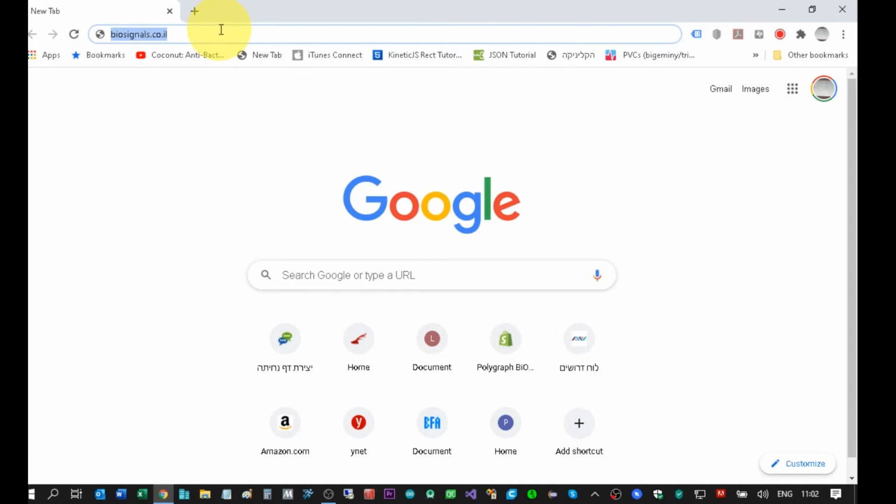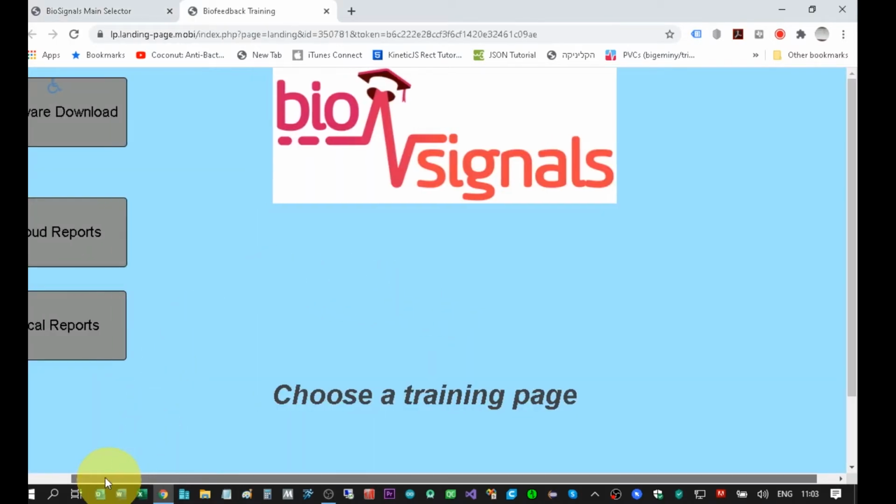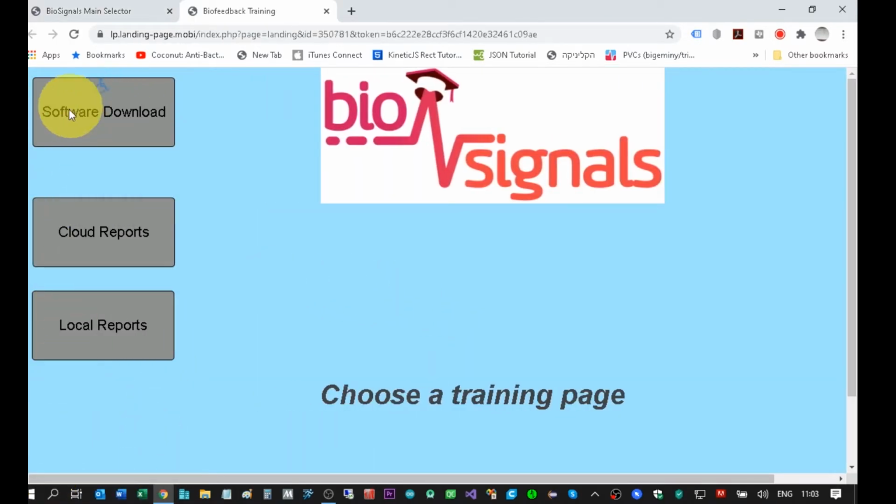BioSignals installation instructions. Let's open the browser and go to the website biosignals.co.il. As a result, we will get a very simple page with two buttons. Let's go to the English system and click on the software download.